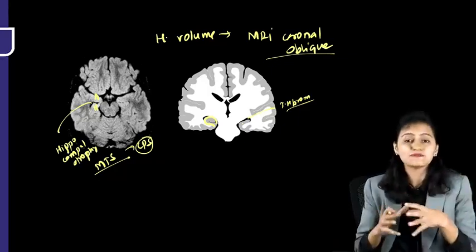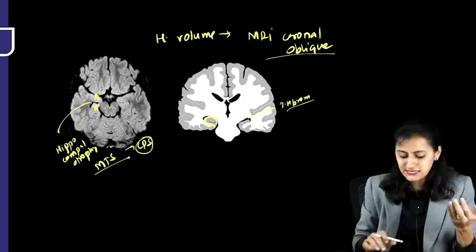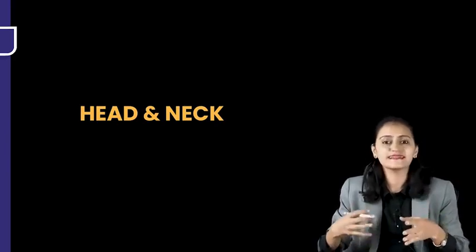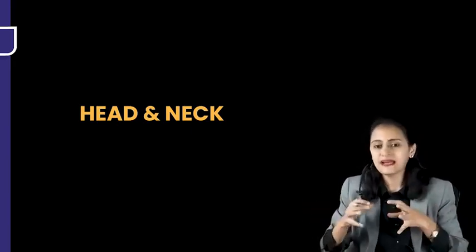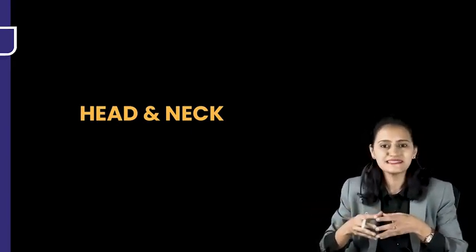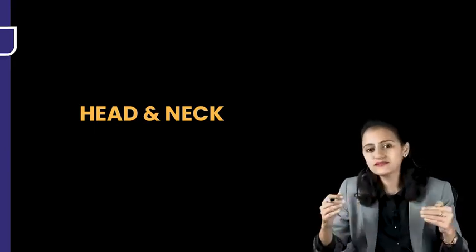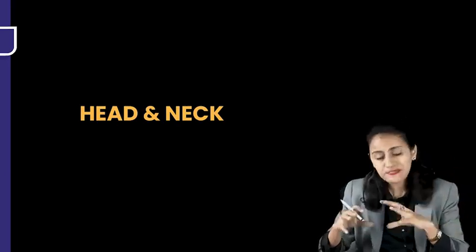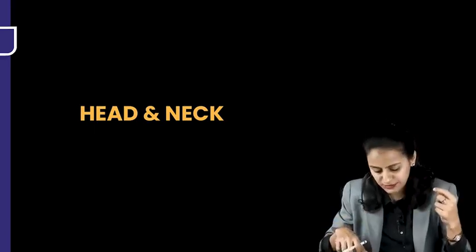So yes, that was about neuroradiology, focusing on the most important images. The next system that we would see is head and neck. Hello friends, so now we are going to learn the important images in head and neck radiology, basically integrating ENT, ophthalm with radiology. And from this section particularly, we have been seeing a lot of questions in the recent exams. So all the images, like in detail, have been covered in the main videos and rapid revision. Here in Snapshot, we are focusing on the most important and the frequently asked images.